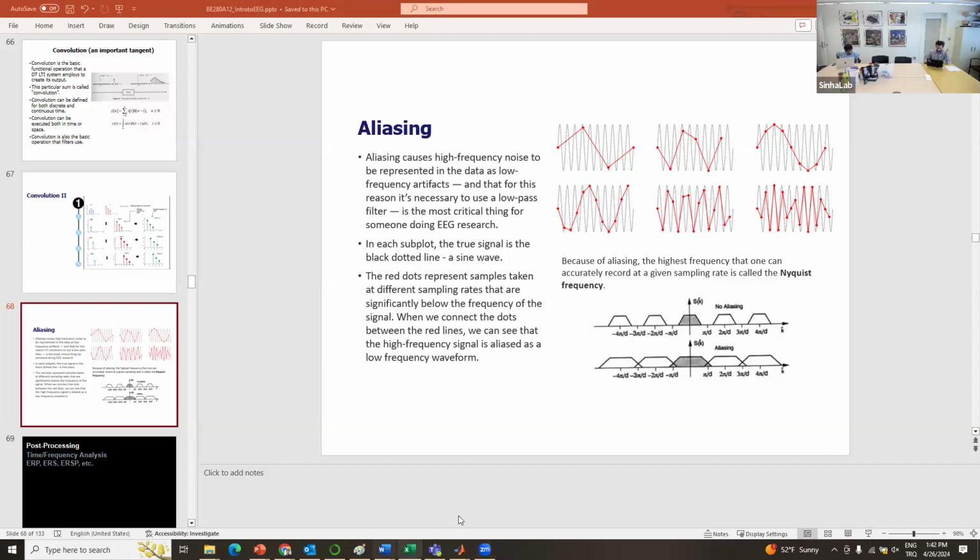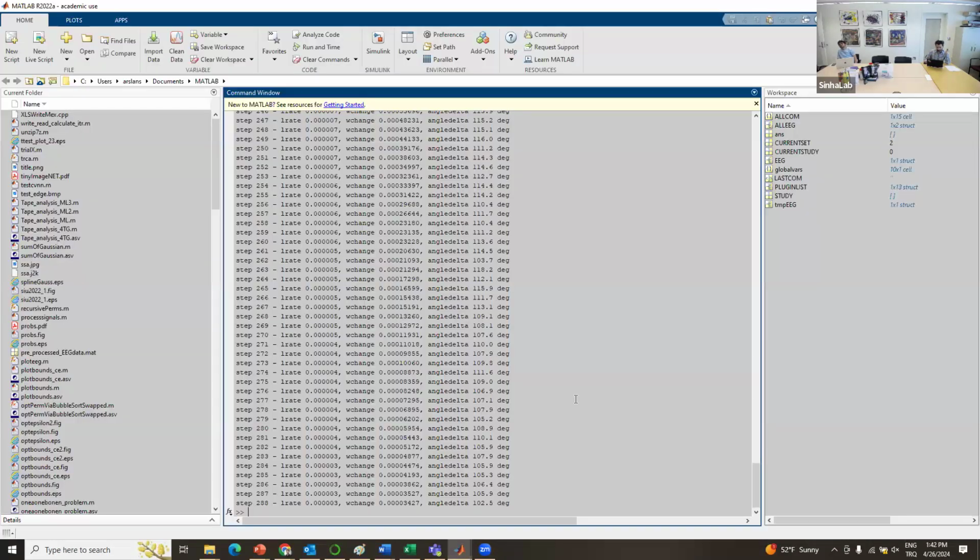All right, I hope we're done. Not done, but we're almost there. If you have any questions, I'll be happy to answer. I would expect this to be running maybe up to 300-something steps. That's kind of the typical number I have from my experience. So we're almost there, but in the meantime, if you have any questions, of course, I'll be happy to answer.